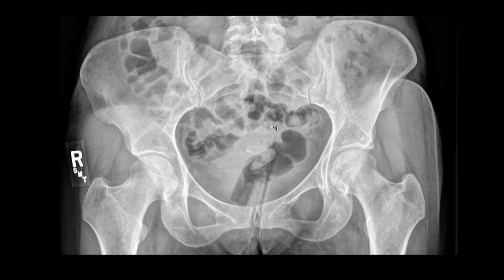Hence, we should be assessing for other signs of pelvic ring injury when we detect this foraminal irregularity, including widening of the sacroiliac joints or pubic symphysis. We should also take a close look at the obturator rings for fractures. I routinely recommend CT in these cases to better characterize whether the sacral fracture involves the foramina or spinal canal and to further assess for pelvic ring injury.